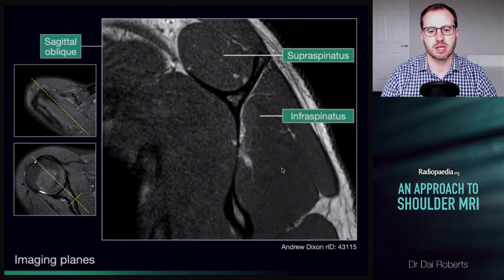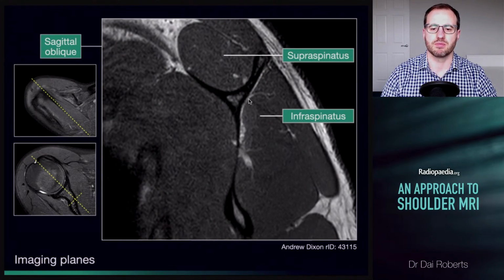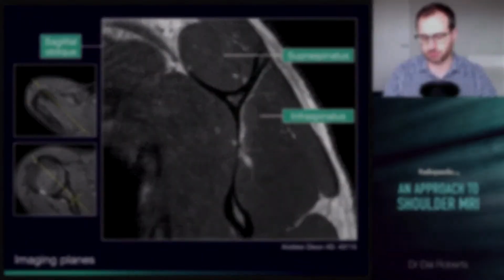As we scroll more towards the chest, medially, we will see the larger bulk of the muscles, and we've got the supraspinatus muscle up here in the suprascapular fossa. We've got the infraspinatus muscle here, subscap, and they all look normal, good, healthy muscles.